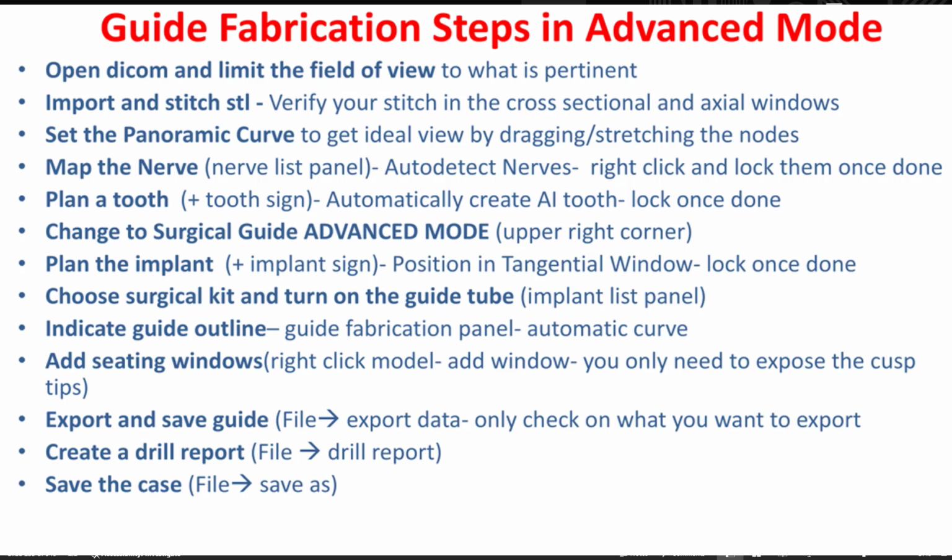So I'll try to throw this up throughout the process when we start a step, and if you'll just get in the habit of always approaching the case this way, that will ensure that you don't miss anything and that your case comes out the way you want it to.